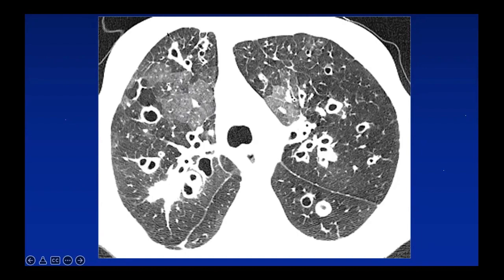Remove the blood, it will become darker like this. So what does that mean? That means the cause of the mosaic attenuation is due to decreased perfusion. There are two reasons for this. One is small airways disease, and the other is chronic PE or vasculitis with the direct decrease in perfusion in patchy areas in the lung.